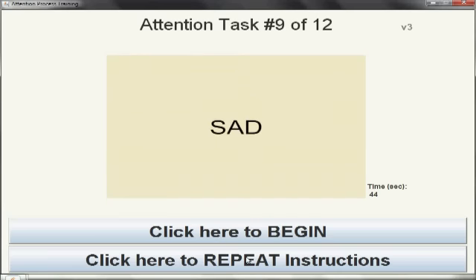Listen carefully. Sad. The word sad was spoken with a sad voice, so you would press the button because they match. Listen again. Sad. The word sad was spoken with a happy voice, so you would not press the button because they do not match.